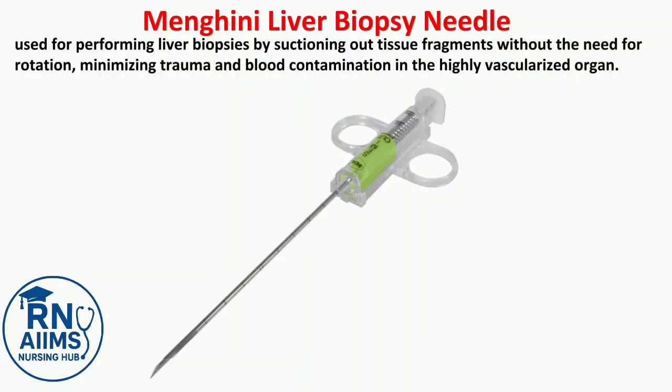Menghini liver biopsy needle. Used for performing liver biopsies by suctioning out tissue fragments without the need for rotation, minimizing trauma and blood contamination in the highly vascularized organ.